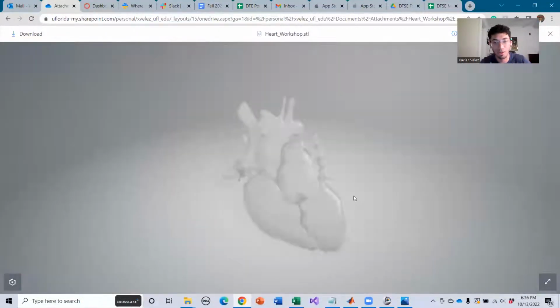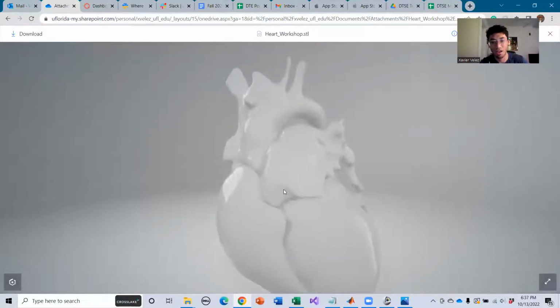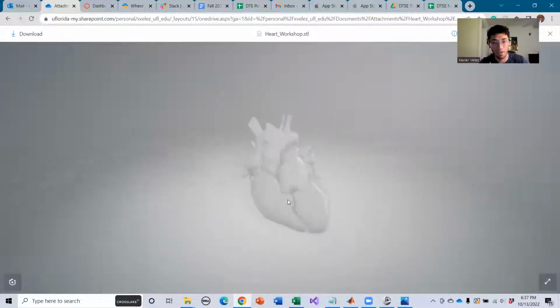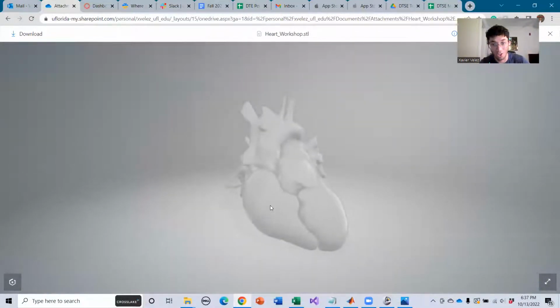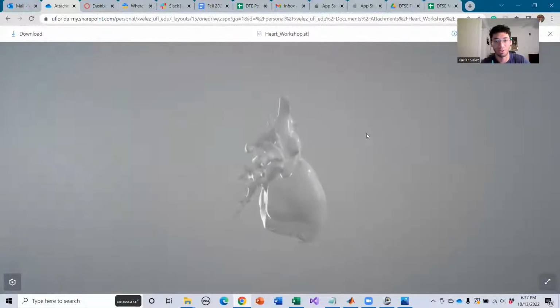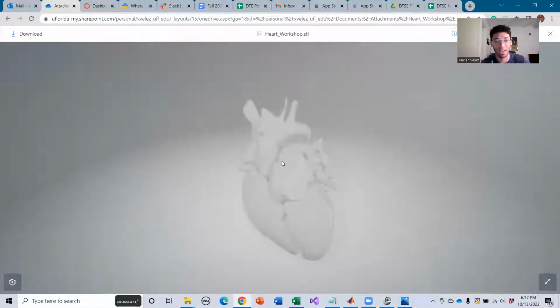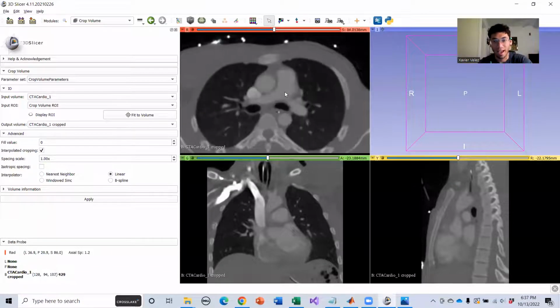It was a little quick and dirty, and I segmented it a little lazily, but we just have the right heart over here and then the left heart, and then I grouped everything else together. I grouped the aorta, pulmonary arteries and veins, superior vena cava, all that stuff is up there, right? So we want to get it like that.